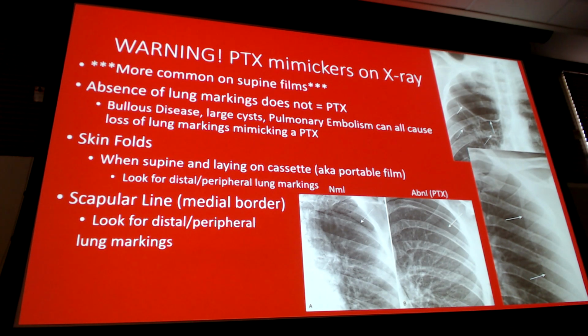Also, skin folds. So some of you at some point in your career are going to see some very large patients that have way more skin than they should because of their size. It's just the nature of medicine, right? And so when you have a bunch of thick, soft tissue in layers, it can present on an x-ray. It can even present in the shape of a visceral pleura and a pneumothorax sometimes, because of how the skin folds kind of come down on the back or in the front.